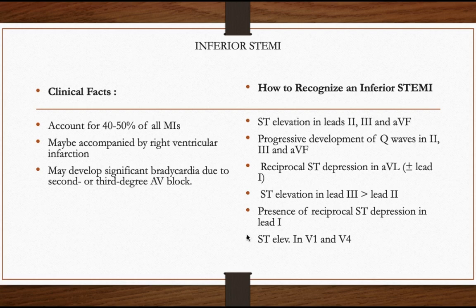So the moment you see ST segment elevation in your inferior leads, quickly go to the AVL, and you may find a reciprocal depression instead of ST elevation. It is rather going to be an ST segment depression in AVL as well as in standard lead 1.